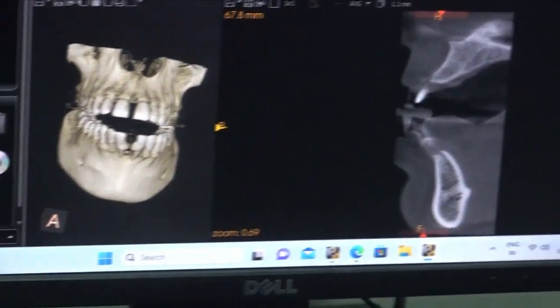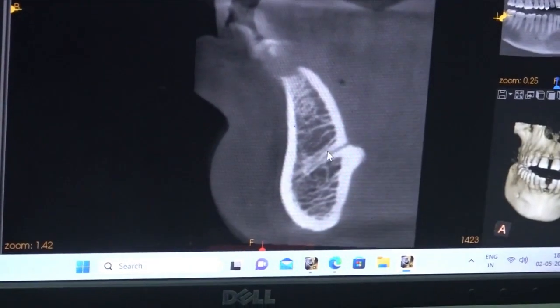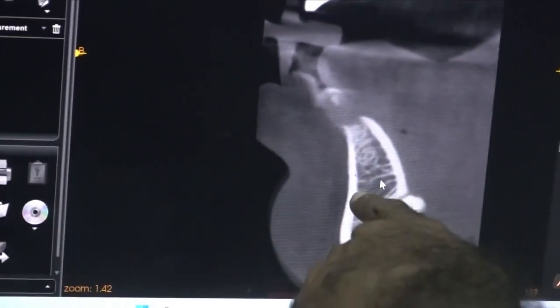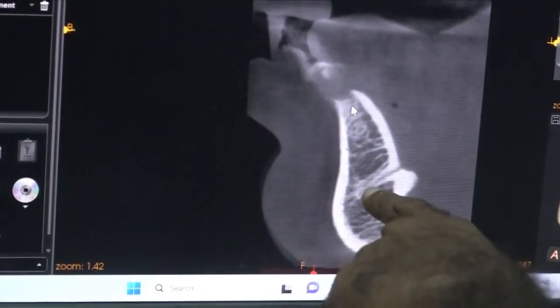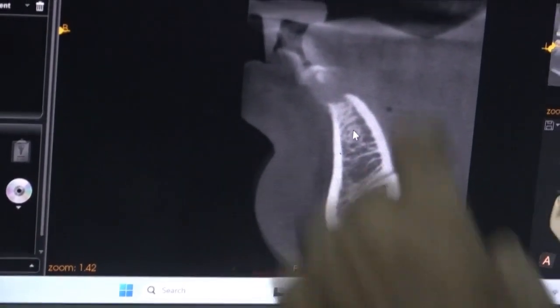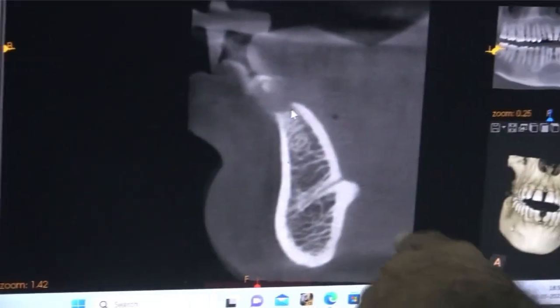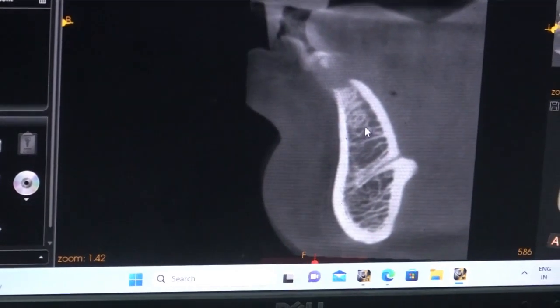Now in the midline we will be... okay. Here also the bone is cancellous. You can see 155 bone. But in the crestal region, the bone is good. Crestal, from here to here. Okay. See here the bone is 532, here 950, 600 till here.